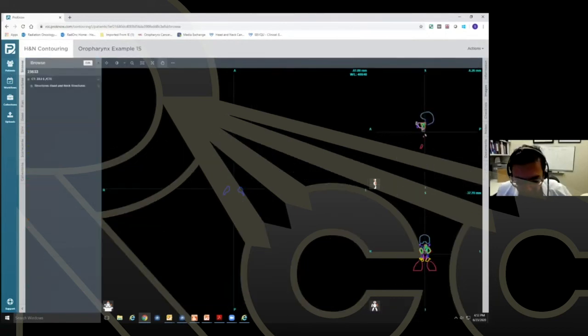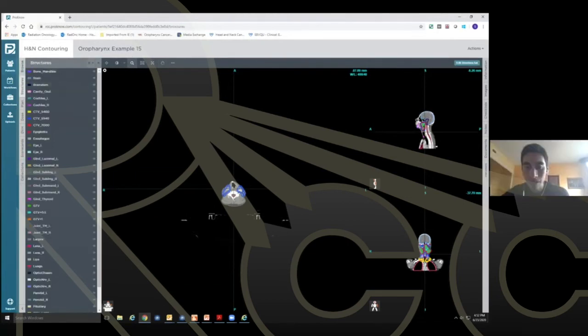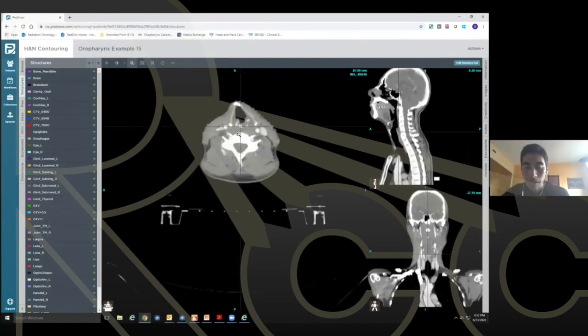Example 15 here. And we have two other questions. One is, are we strict in just including the fat space between the SCM and the thyroid, or can we include the posterior part of the SCM? Jason, if you want to unmute your microphone, you could ask the question.